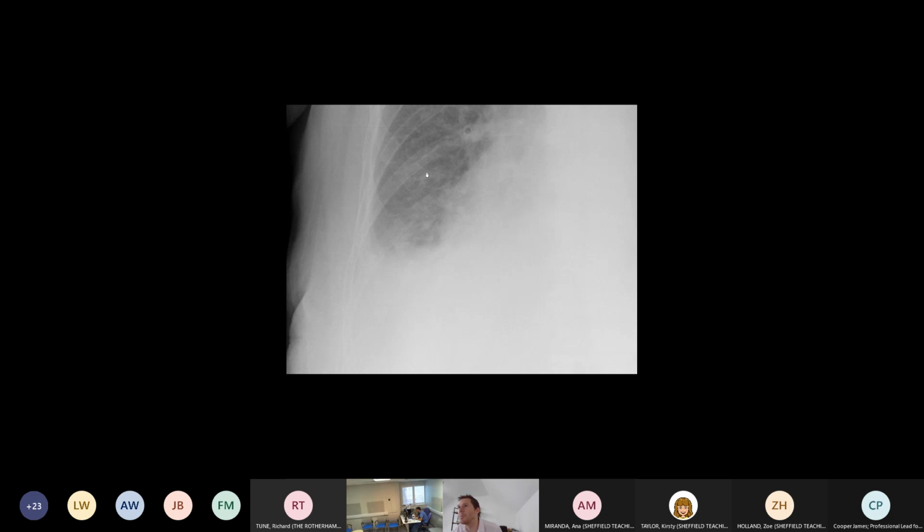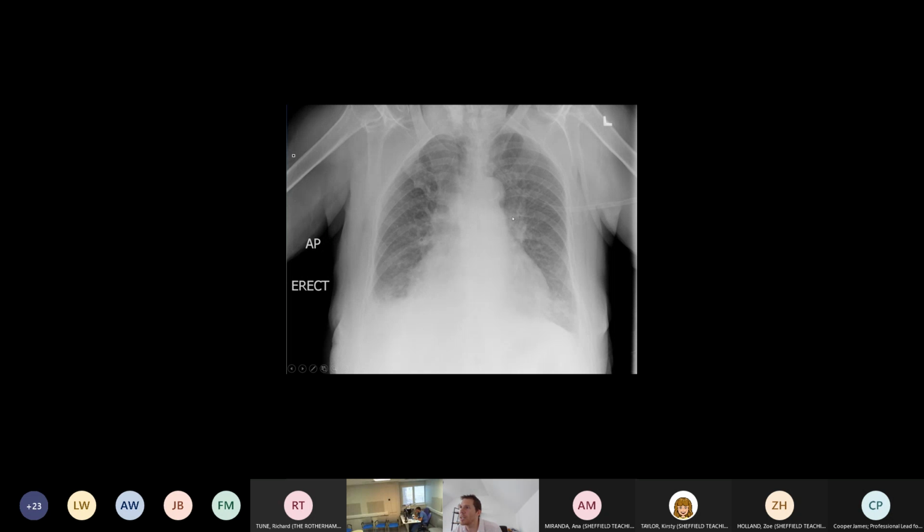We can see through ribs. You do get a rib edge on every rib, but you can see through ribs. You can't see through this. This is a pleural effusion. The whiteness of an effusion you shouldn't be able to see behind. So we've got cardiomegaly, we've got upper lobe diversion, we've got bilateral lower zone consolidation that's relatively symmetrical, we've got small bilateral effusions, we've got all four features of heart failure.